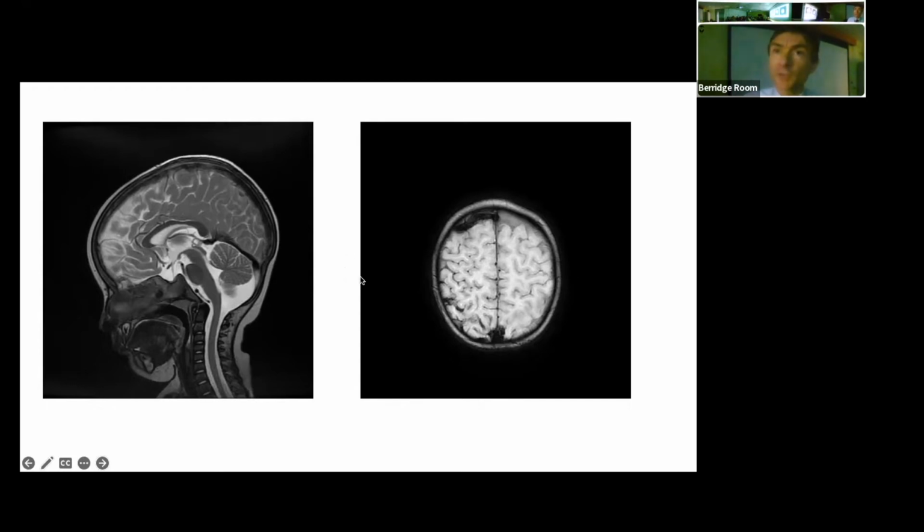And then when you look on the sagittal, you can argue that this straight sinus, again, is a little bit enlarged, although it's low signal on T2, which we would associate with flowing blood. But you can see there is a kind of a caliber change here, which is a little bit odd, that the internal cerebral veins are sort of normal and narrow, and then it becomes a bit more bulbous here. But I think, yeah, it's not unreasonable that those signs were overlooked.